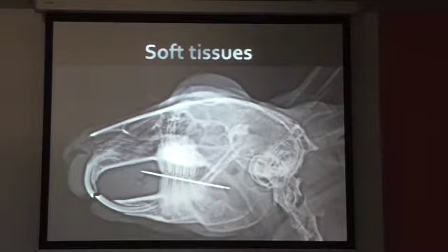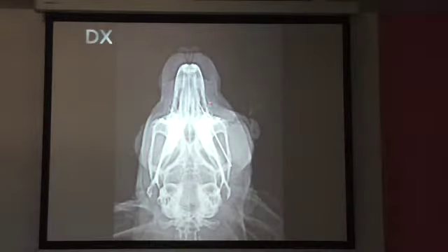So there was a needle, so this rabbit swallowed a needle. And what you could see here, there is a radiolucent area here.